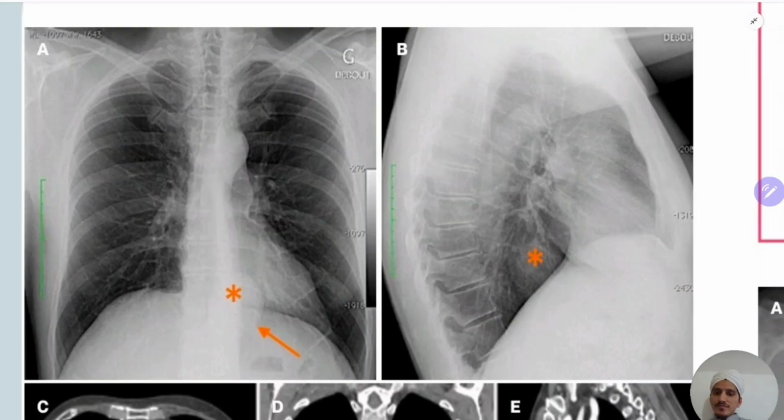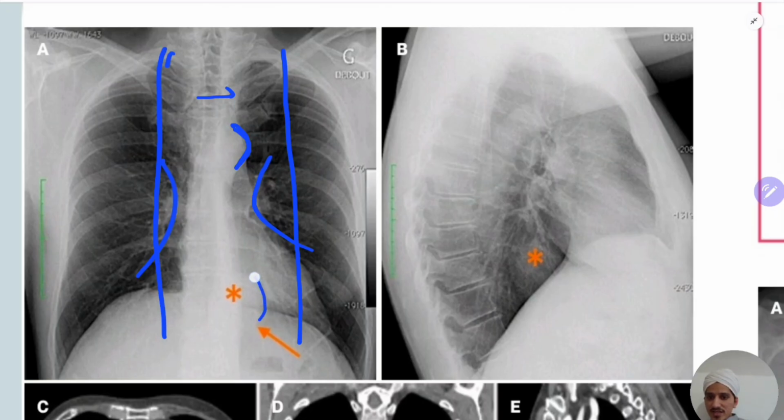You see the middle part of the lung to see a mass. Okay, so carina is okay. Aortopulmonary window is not obliterated. Okay, it is good. This is the aorta. Mediastinum is not widened. But in the lower part you just see there is an opacity like this.